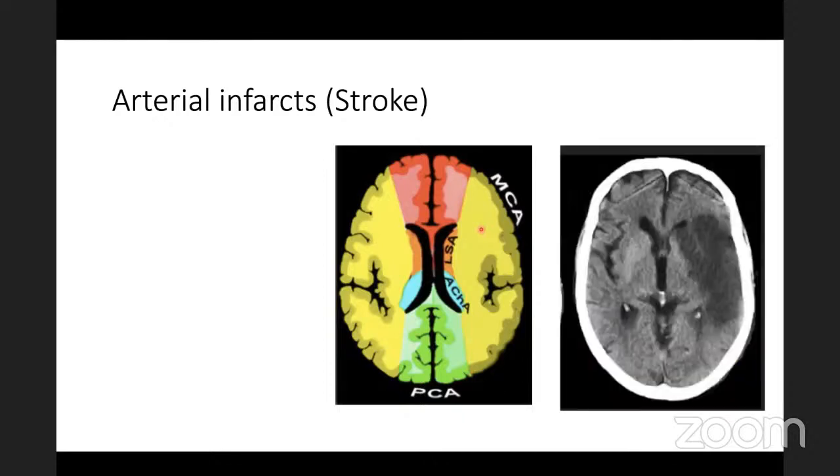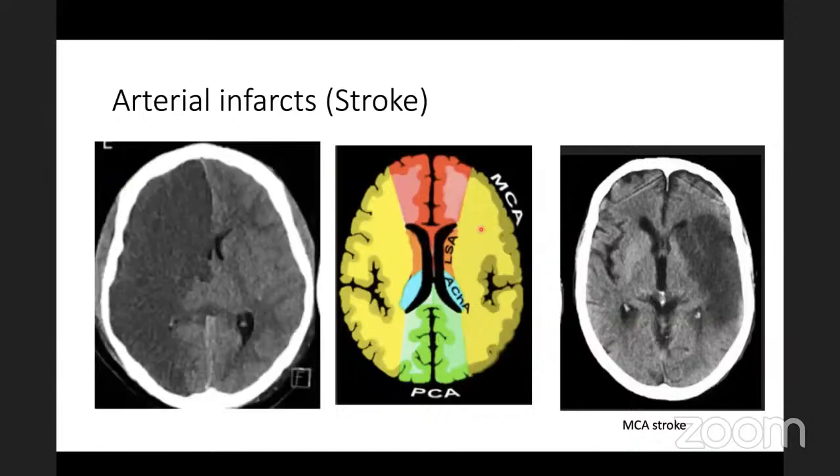So on the right, as I had already shown you in that case with tubercular meningitis, you can see that the MCA of the left side is involved. So this is a MCA stroke, right? When an MCA and ACA is involved, you know that the stroke is internal carotid artery stroke, because two of the branches are involved. So the stem of the artery should have been involved. So ICA is involved, right? This you had already seen in the child with non-accidental trauma, which had also shown an ICA stroke, but on the left side, now it is on the right side, right?